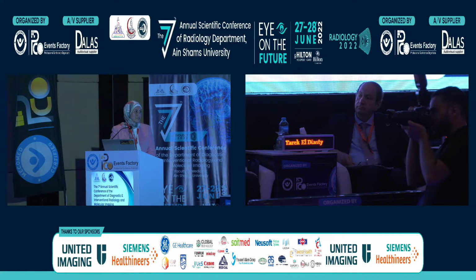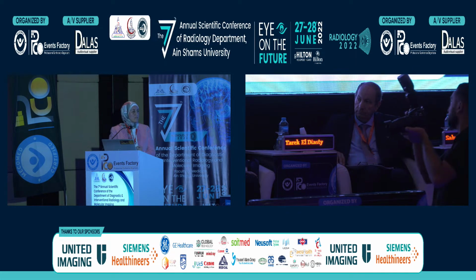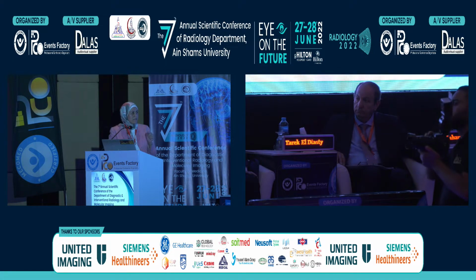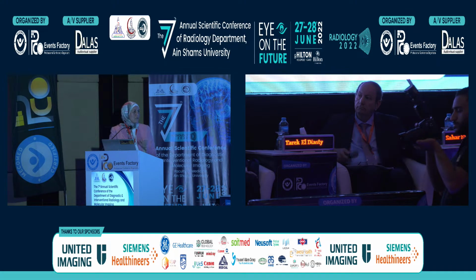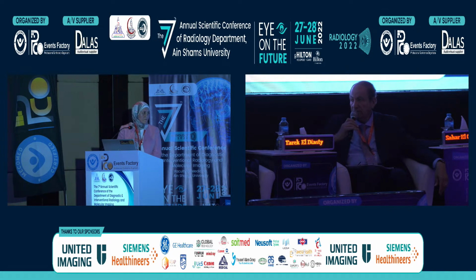Sometimes contrast injection is helpful in discriminating VI-RADS 3 lesions and also in VI-RADS 4 lesions, because the interruption of the mucosa on the enhancement on the dynamic study, enhancing mucosa, is more sensitive than the diffusion, because we can't discriminate whether it is extending deeply into the muscle or not. But on the DCE, it is very easy to identify the disruption of the mucosal enhancement. Thank you.